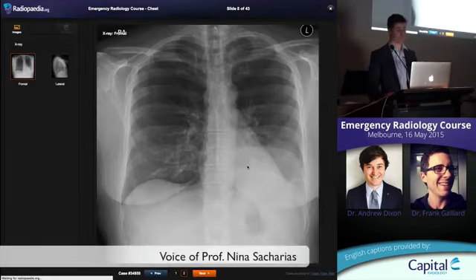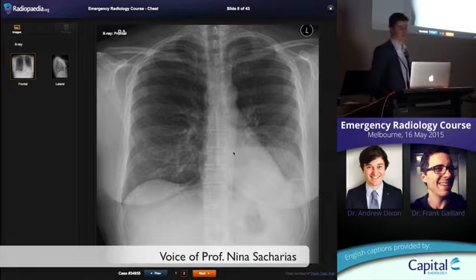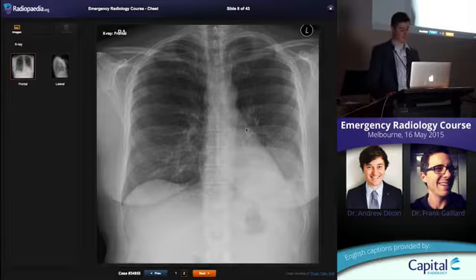Andrew, I promise not to say. You promise not to interrupt. But I can't help it. Because you ought to see the aorta. You ought to see the aorta, that is correct.